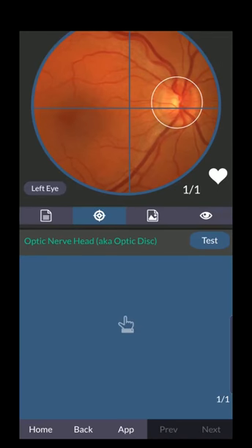You'll also notice on the target touchpad there is a fraction, in this case 1 out of 1. That means there was 1 annotation in this particular set, and you hit 1 of them. So you got all the annotations correct for that optic nerve head. There's only 1 optic nerve head, obviously.